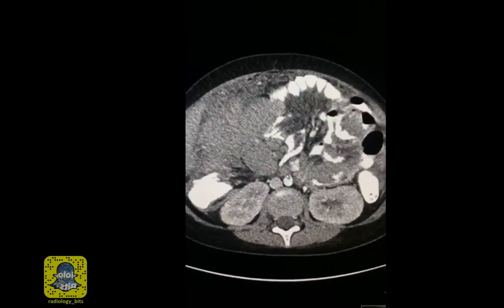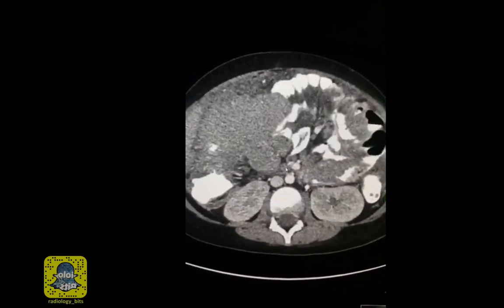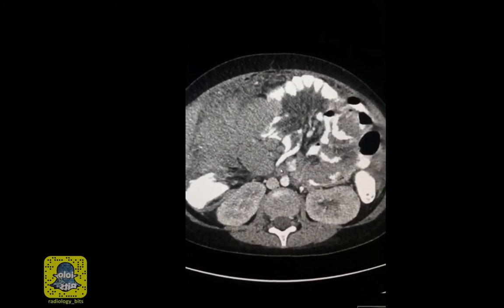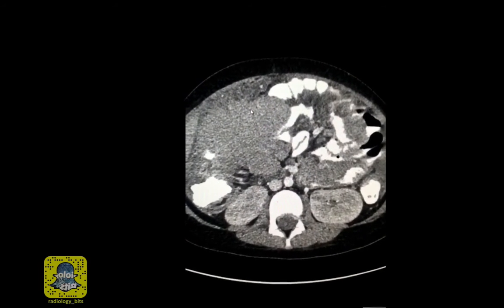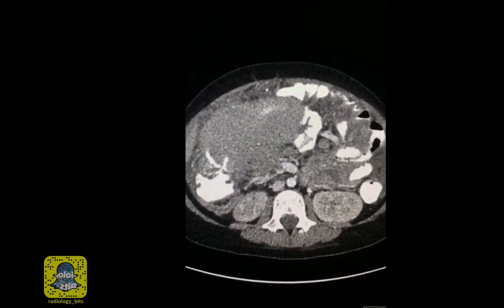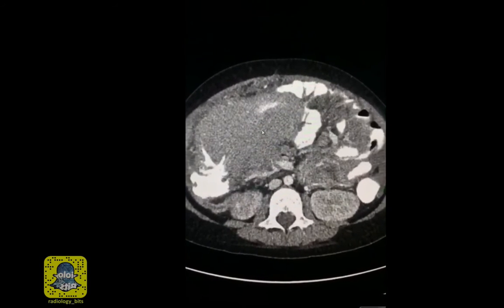The presence of these intraperitoneal soft tissue masses, which are consistent with lymphadenopathy, could be seen with lymphoma or metastasis. However, if this were to be metastatic, there are two unusual features. Metastatic deposits of large sizes are classically necrotic in the center, and this is not the case here, and that favors lymphoma.